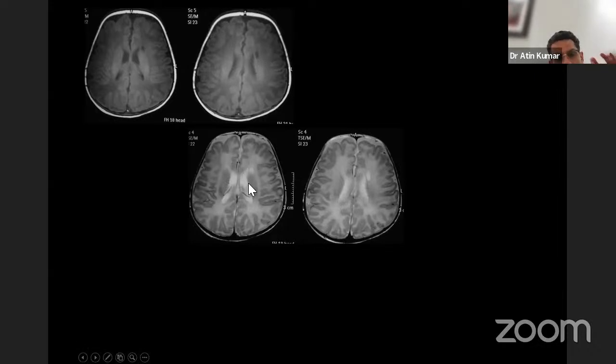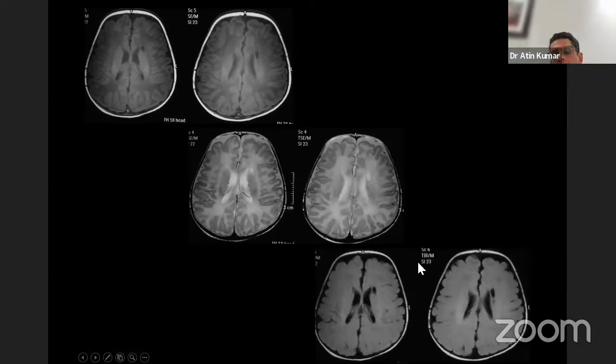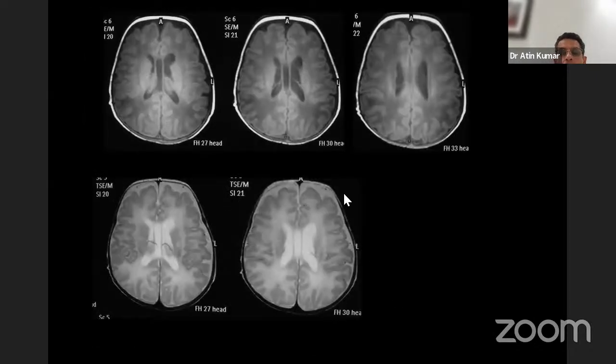So you can see and diagnose small cystic lesions, which you can see very well on ultrasound also, but you can diagnose them on MRI also if you have done the MRI, and you can clearly see them on FLAIR also. I told you there is some advantage of FLAIR. Only when you are looking at cystic lesions, you can use FLAIR. You can identify them very clearly, better than T1, better than T2. You can identify them on FLAIR sequences also, small cysts also.